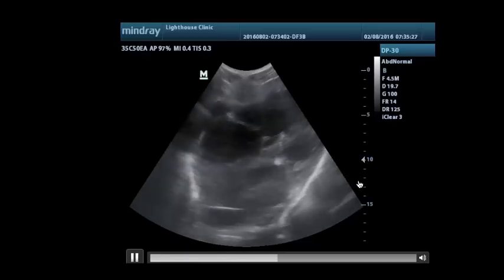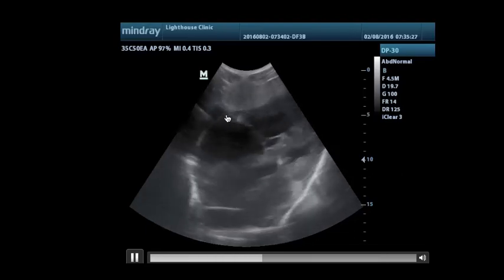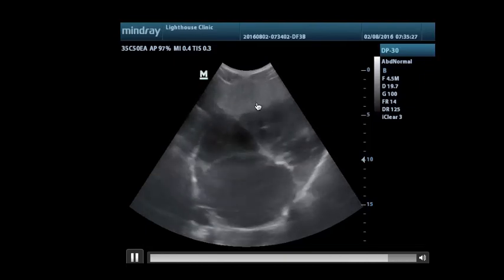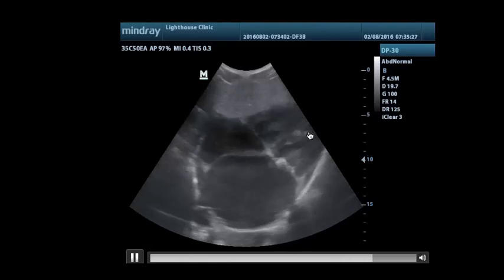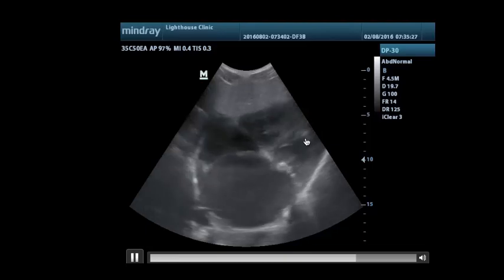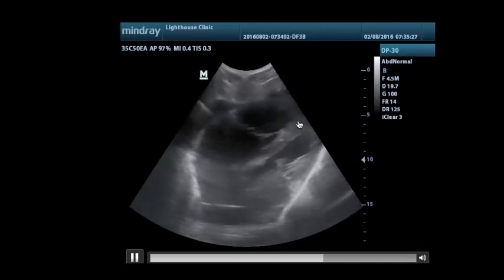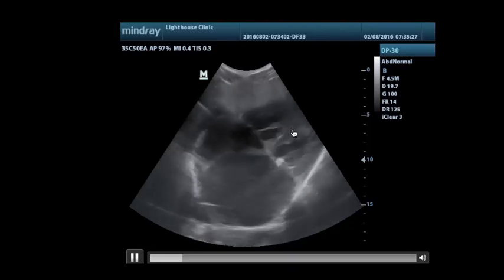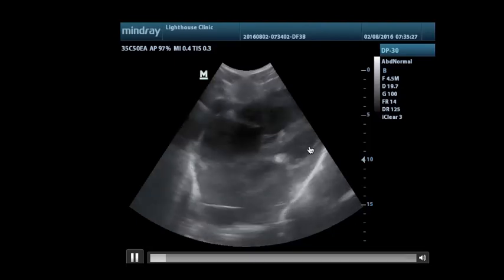This is her ultrasound. What do we see? Let's go through our questions. Is there a pericardial effusion? Well, there might be a little bit here, but it is hardly worth mentioning. How is the left ventricle pumping? It is slow, but it is pumping reasonably well. There is contraction and concentric getting smaller of the left ventricle. How do left and right side compare? In this view, it seems that the right is slightly bigger, but it is almost the same, so it is not as marked as it was in the example before.